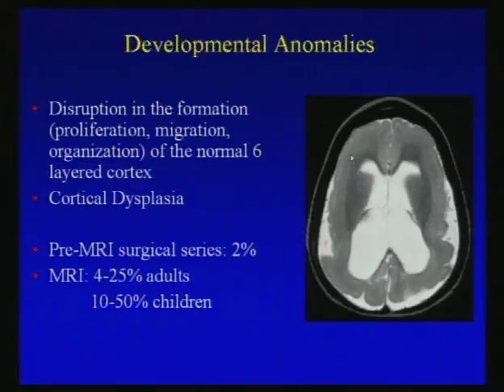We see diffuse cortical thickening and some evidence of sulcal formation. So in this smooth type of brain, this is in the spectrum of a lissencephaly, but we see some sulcation, so this would be an incomplete type of lissencephaly. These patients generally do not do well clinically.